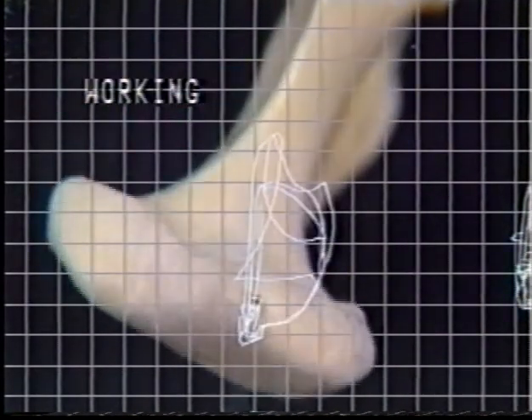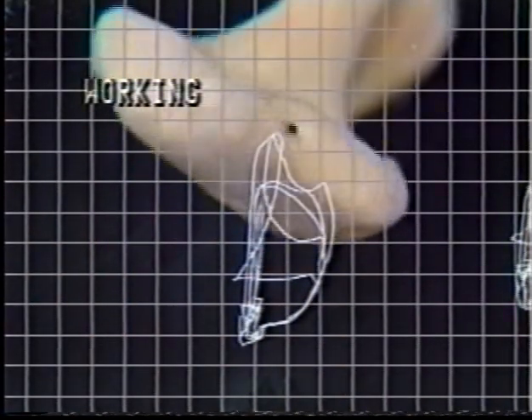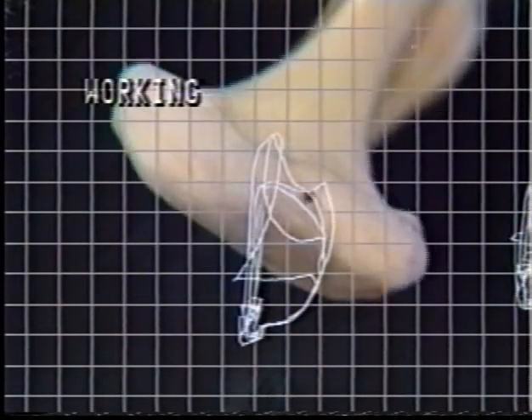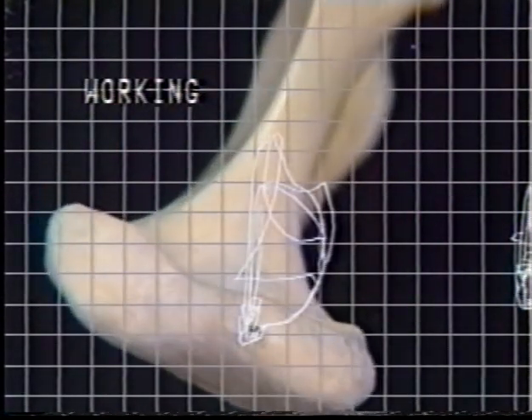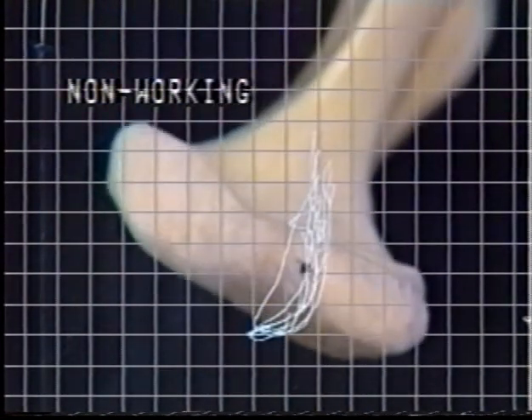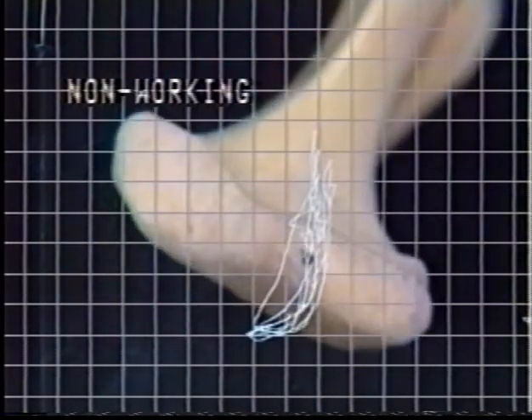The top view of the left working side condyle shows lateral closure strokes, which are followed by medial movements with no identifiable intercuspal position. When food is chewed on the right side, the left non-working side also shows the extreme looseness of the joint.